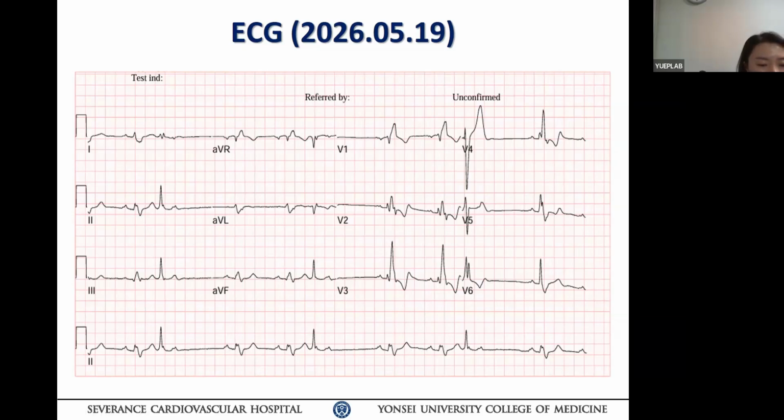Okay. Why am I asking that question? Potentially, sometimes to determine the conduction. There's a ventricular-atrial P wave. Particularly when the coupling of a PVC gets shorter to the T, the subsequent P can be triggered by the sinus node prematurely. The only reason I ask is if you look at lead one, look at the P wave in sinus rhythm, then the subsequent P wave is the same. That's why I'm asking this question now.